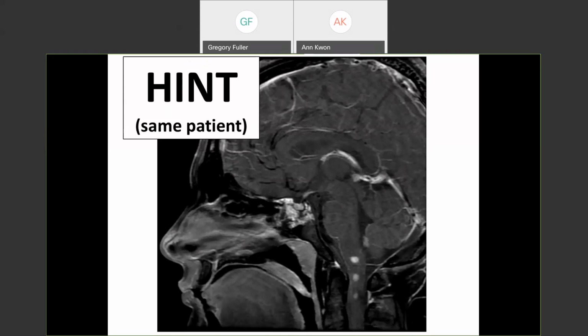Now, where is this located in the cord? Again, I'm going to point out, can everyone see the cerebral aqueduct right here? And here's the pituitary. We are in the midline. Now, these could be really big, but they look like they're in the center of the cord. We would want to see the axials to confirm that, but these are lesions. It looks like multiple, which is a little unusual, but not in NF2. What do you expect in the middle of the spinal cord in an NF2 patient? What do you expect these to be? And the answer is, of course, ependymoma.